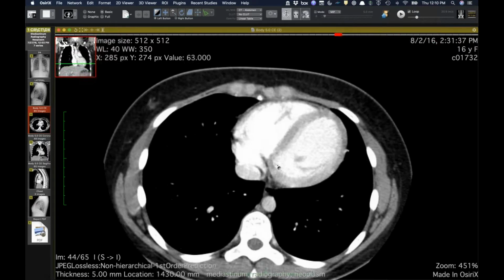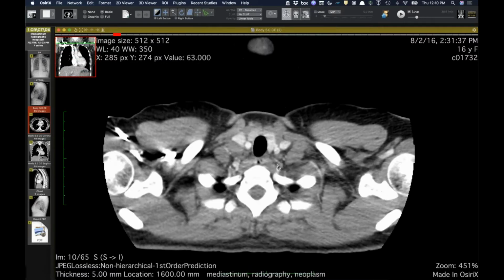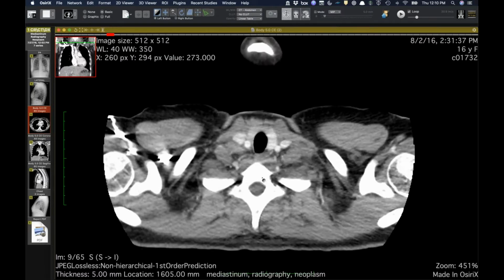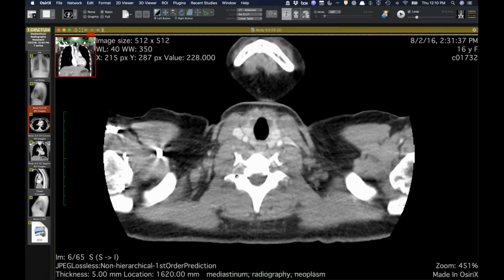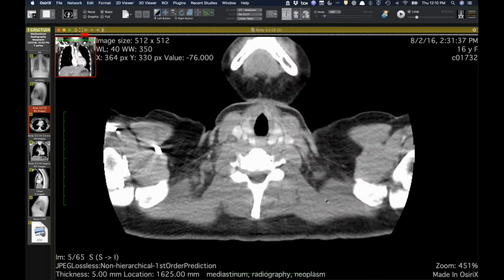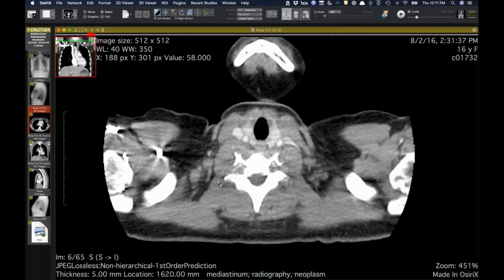Right. If you had a cervical node, you'd expect there to be sort of high mediastinal nodes, super close. I'm not seeing much there. Maybe one node. Not much. I guess it could not cause a big node, but still have reached. Right. Like there are some cervical nodes. You're right. Maybe it just extended down. Yeah, and there's some posterior for sure cervical nodes, but yeah, no, but that was my thought too, Jeff.